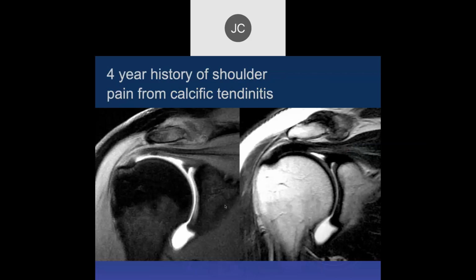Now, there are papers a number of years ago that looked at the thickness of the superior recess to see whether the thickness correlated with whether arthroscopically it was called a tear or not. And the thickness actually did not correlate. So you can have normal recesses that can be 4 or 5 millimeters. So the thickness is not important.